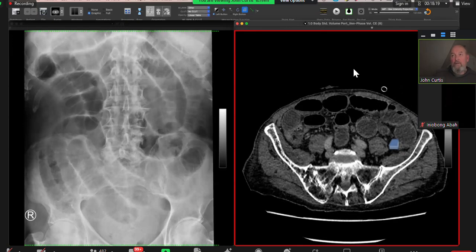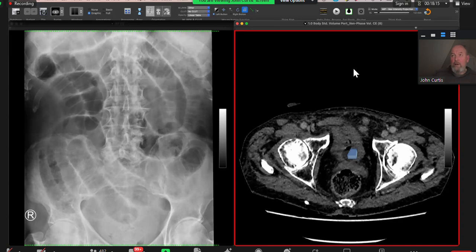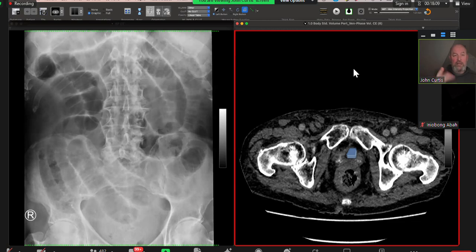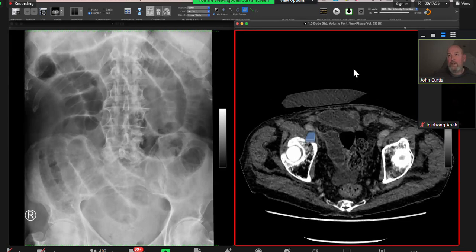And then we can see a hernia. And because the femoral canal is very small, and because it's got 3 structures in it, an artery, a vein, and a nerve, it's the vein that gets compressed. Okay. And the vein gets compressed because it's a femoral hernia. There you go. You can just see it there.